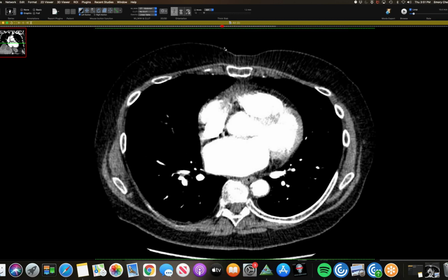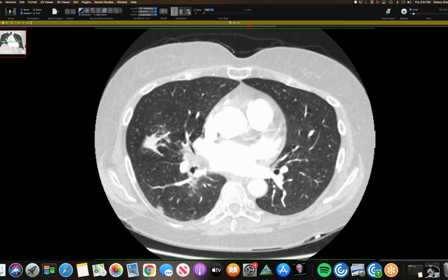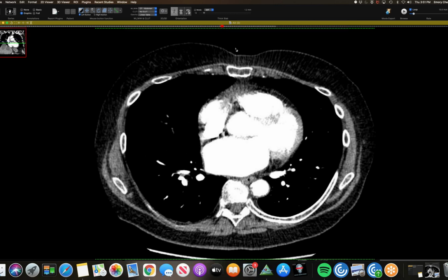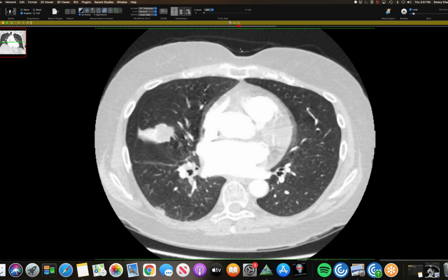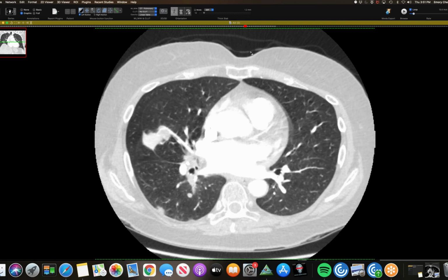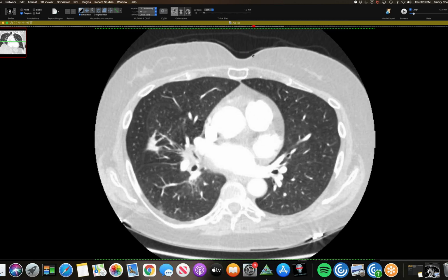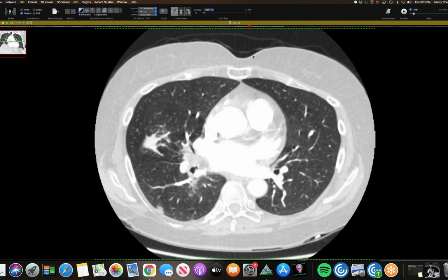Wow. Yeah. So the lesson I learned from this is not to be too overconfident. I'm glad you had a little bit of suspicion there, because you also don't see the surrounding ground glass and even crazy paving like we often see with lipoid pneumonia, because I think of it as more of an ill-defined thing. The sense I get from this is there's some kind of post-obstructive process here, also with some volume loss. So that's why I wasn't super confident.